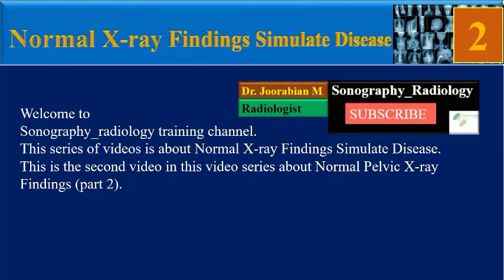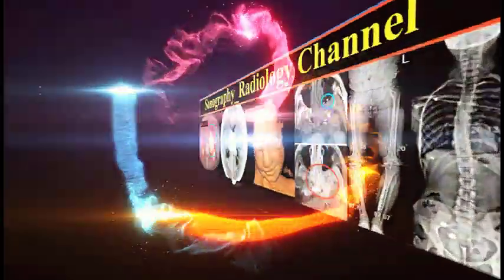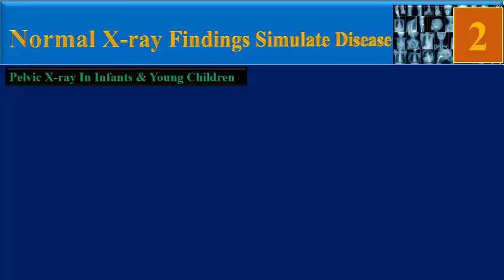This series of videos is about normal X-ray findings that simulate disease. This is the second video in this series, about normal pelvic X-ray findings, part 2. In this video, we will review 10 cases together.